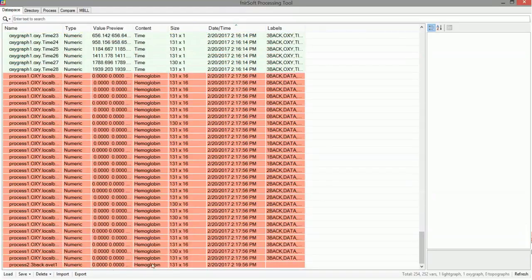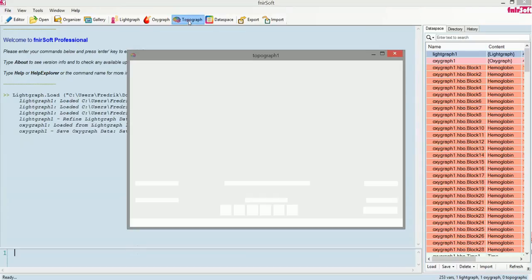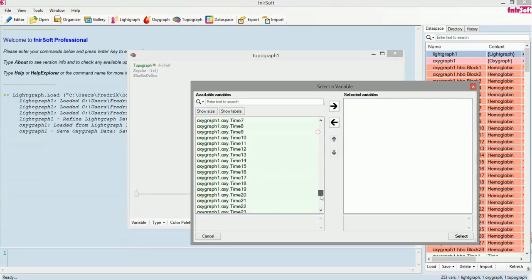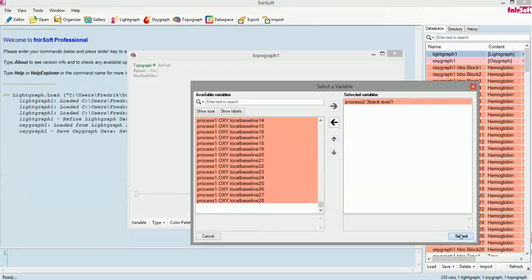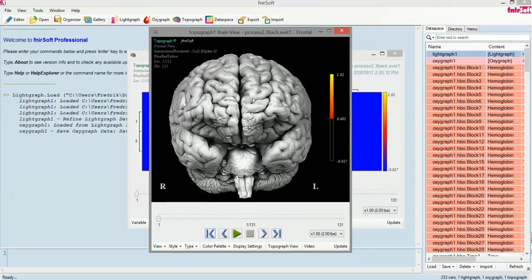And it's now in the bottom here, and then we can go to the so-called topo graph. I will load this file there, and I will choose interpolated and brain view, and this is the topological image of our typical stock brain, and we will just overlay here. I will also play this back at 4 times the natural speed, because the process I'm about to show here as a video is, in reality, 1 minute long. Now I run it at higher speed, and we can also adjust the thresholds here.